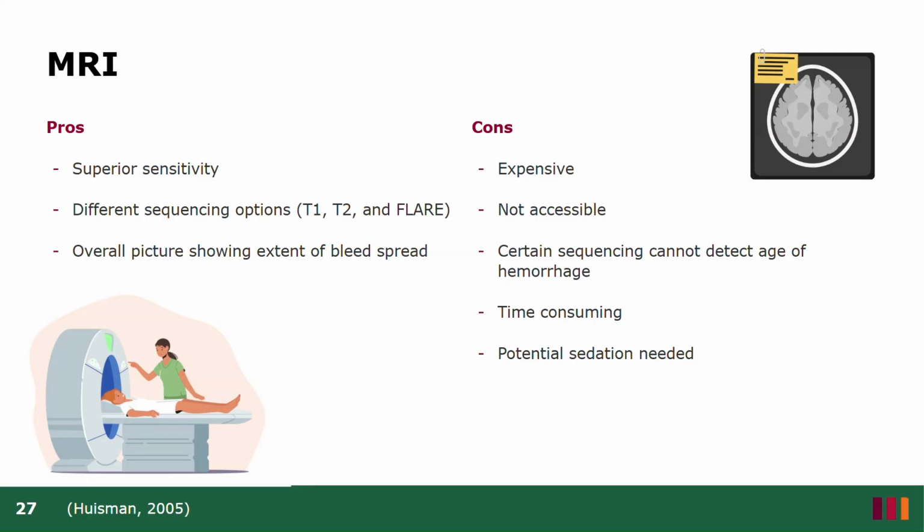In MRI, radiofrequency pulses are sent into the body. The sequence of these pulses can be manipulated to produce differently weighted images in terms of contrast. Each weighting means that we can visualize hemorrhages in different ways. Most commonly used are T1, T2, and FLAIR sequences. The stage of hemoglobin breakdown also produces a different appearance, allowing MRI to detect the age of the bleed.